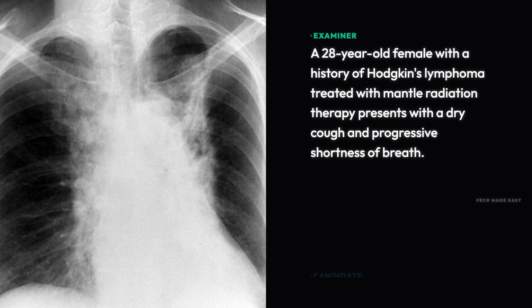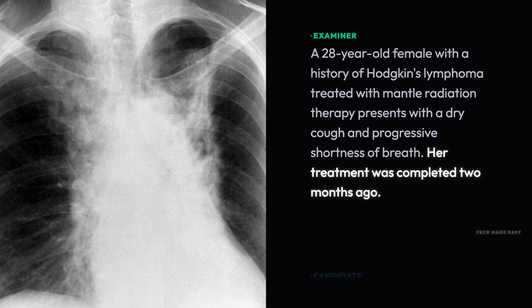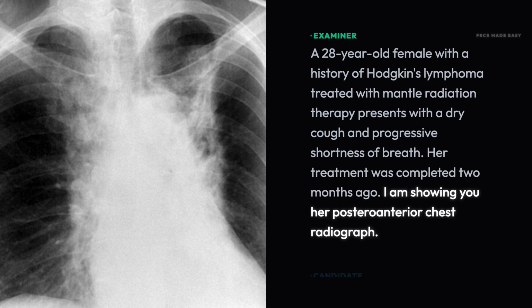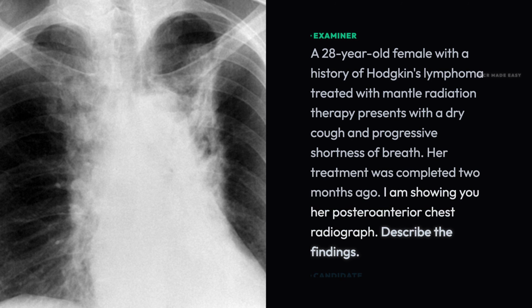A 28-year-old female with a history of Hodgkin's lymphoma treated with mantle radiation therapy presents with a dry cough and progressive shortness of breath. Her treatment was completed 2 months ago. I am showing you her posteroanterior chest radiograph.